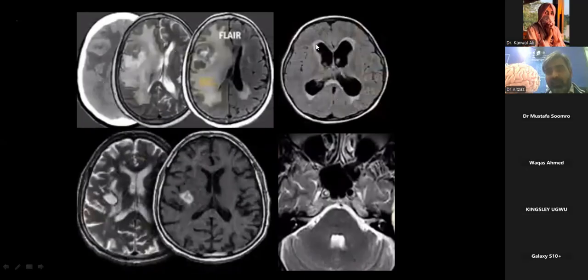And what is on the side? Periventricular lucency, seepage is there. That is again a kind of edema. That's why it is hyperintense. This is subacute blood. And what is here? What's the problem in this one?